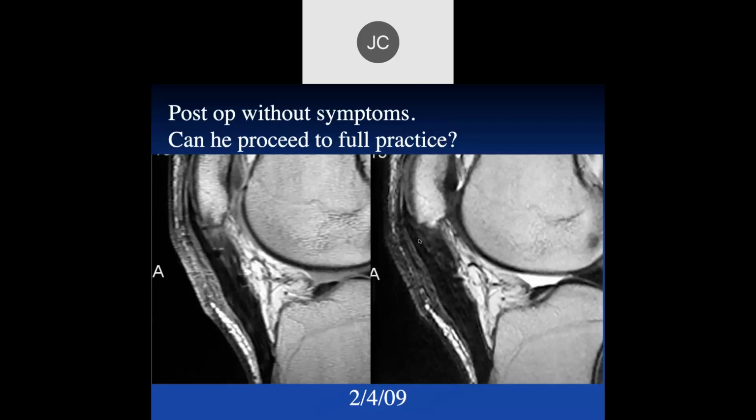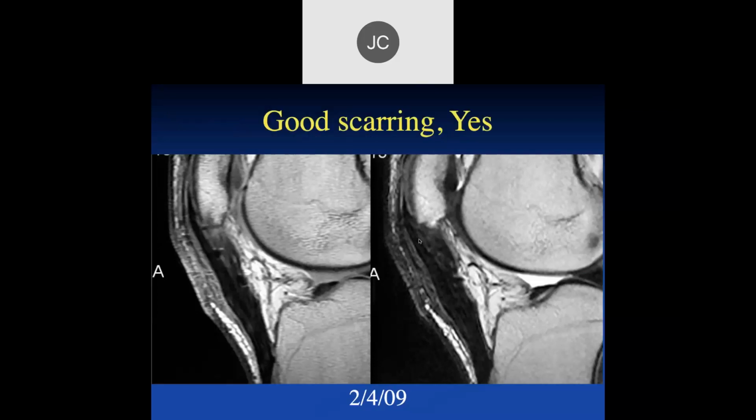It looks like there's post-operative change within the patellar tendon, with thickening. I guess maybe some scar tissue. I'm not sure. It looks like it's healed. It looks like it's intact. So would you tell him it's okay for him to practice? Sure. So did I. He did okay.